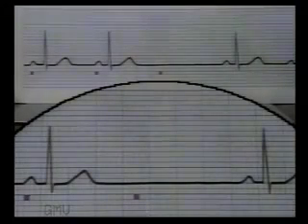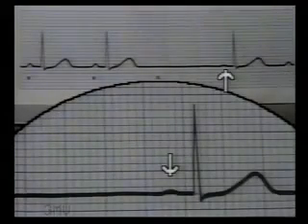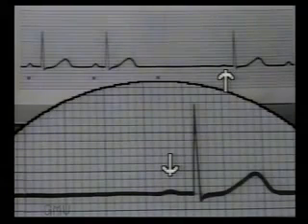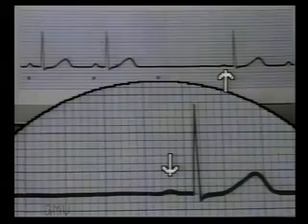A careful study of the beat after the sinus pause will tell you the origin of the escape beat. This ECG shows a pause with a preceding normal sinus beat and normal T wave. The escape beat shows a slightly altered P wave and normal QRS complex. So this is a sinus arrest with atrial escape beat. Note the slightly altered P wave of the atrial escape beat.